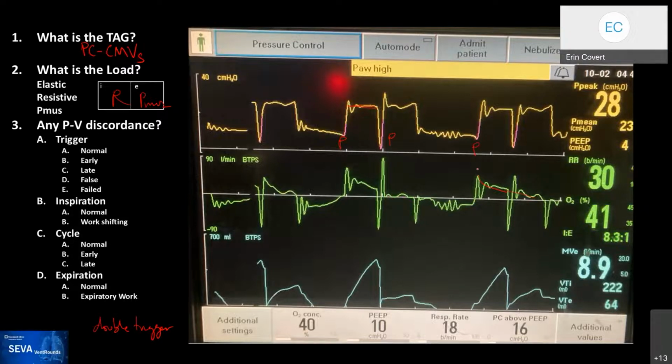The flow moves up and crosses very nicely. Again, the pressure goes in. There is this oscillation to try to maintain the pressure. Then the pressure goes down. And the flow goes really down and then again up, triggering another breath and getting this kind of continuous delivery of breath until it ends, and then the patient exhales.